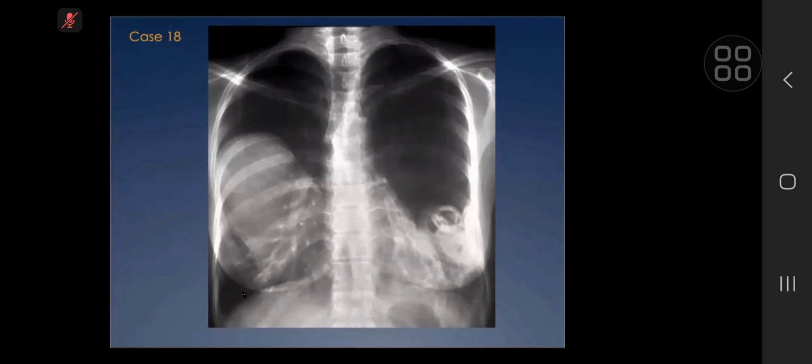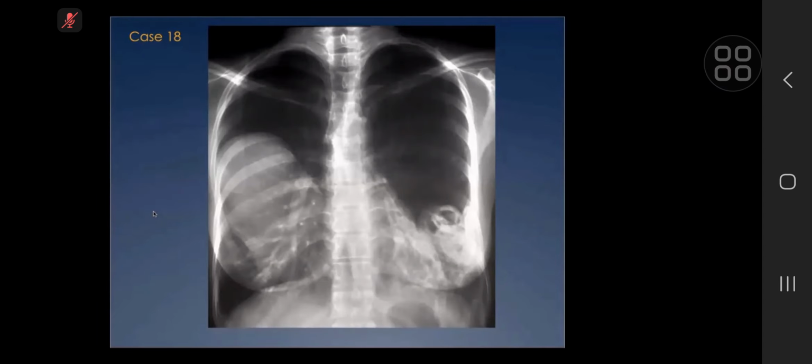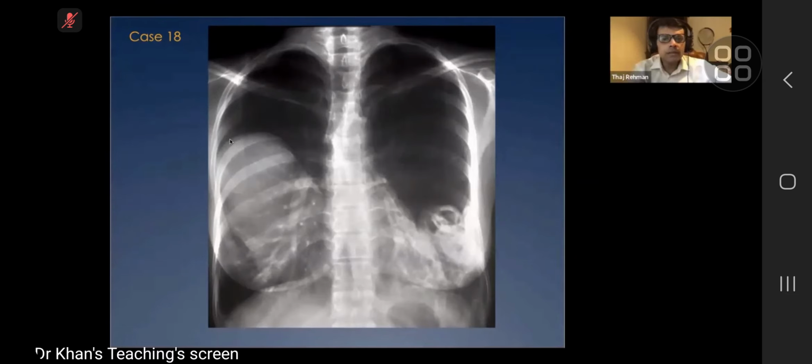For the chest radiograph, there is abnormality on both sides of the lung. On the right side, there is quite a diffuse opacity in the right middle lobe, and the bulging of the fissure. So I would describe it as a rather well-defined, smoothly marginated mass lesion.